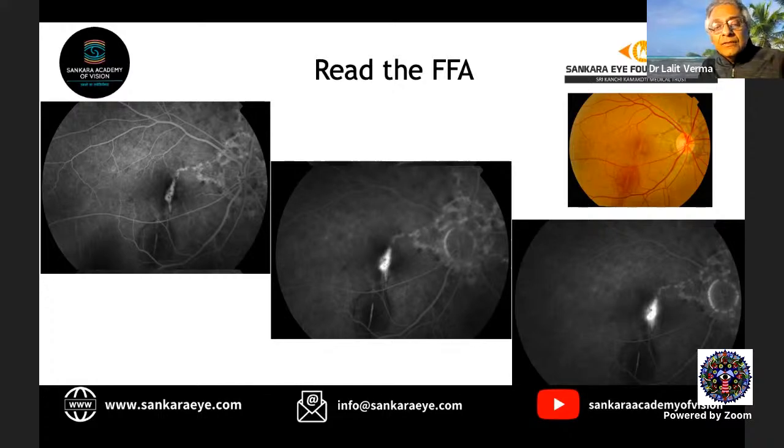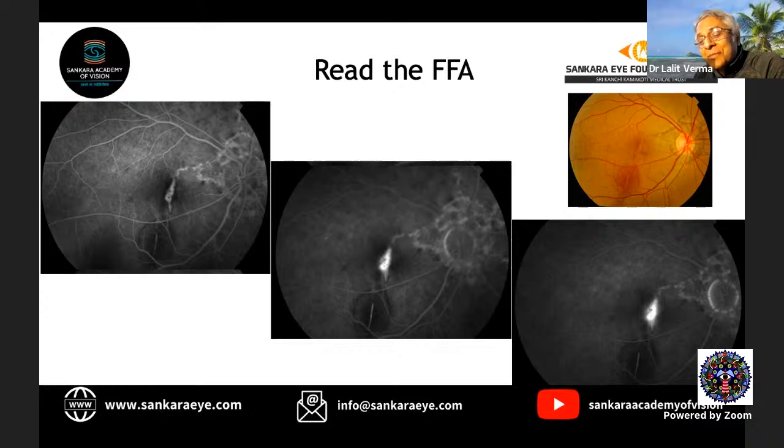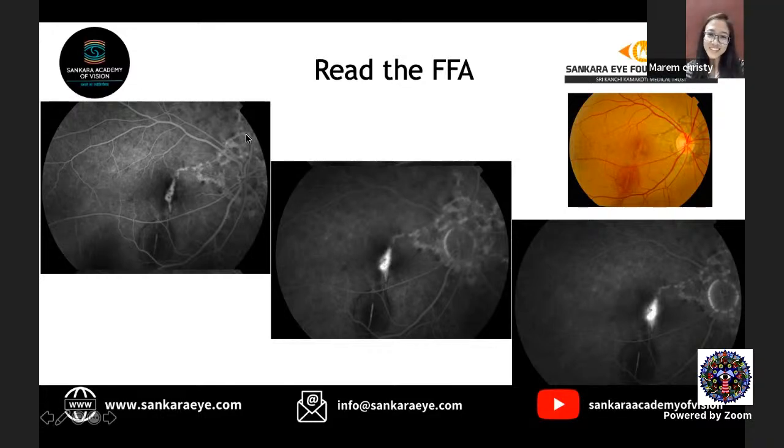And if you see the fluorescein angiogram, the three phases which Pradeep has shown from early to late, there is an increase in the hyperfluorescence here, which is suggestive of CNVM. So these tracts and CNVM point towards the most probable diagnosis of angioid streaks in this patient. So don't jump to identification of CSR. For all this lecture, what Pradeep has labored so much goes waste. So please don't jump to diagnosis.